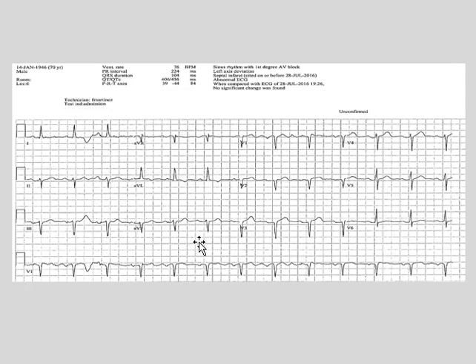And Q waves. Now there's a little R wave there, so that's not a Q wave. Again, let's have a look at these. Now these look like definite Q waves to me. They're more than one little square wide, and they're certainly bigger than the 1/3 of the QRS complex. They dominate the QRS complex, and they're in the septal territory.